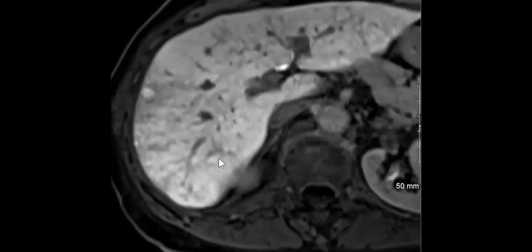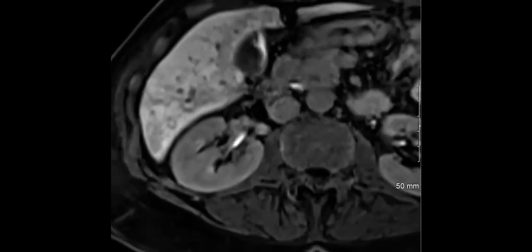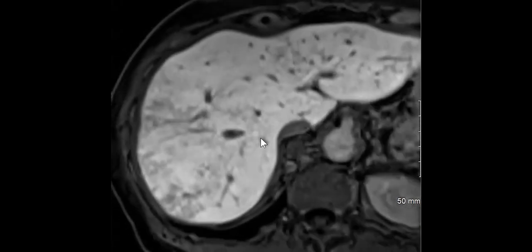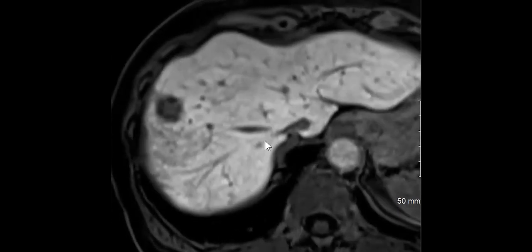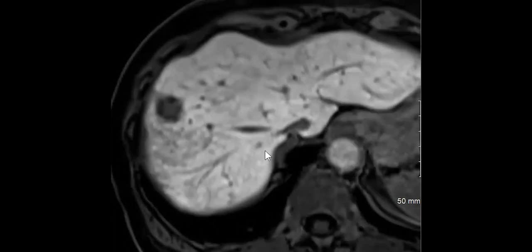Wow, I can't believe you have so many cases of this. So this is the cool part, because I called SOS, right? Sinusoidal obstruction syndrome, the patient was on the appropriate chemotherapy drugs, and I said, you know, SOS. In a tumor board, the clinicians kind of scoffed at the diagnosis because the patient's liver function tests were okay, and there was nothing that they thought indicated that the patient has SOS. So they thought I was crazy, per usual. No, I'm kidding, but they did not totally believe the diagnosis.